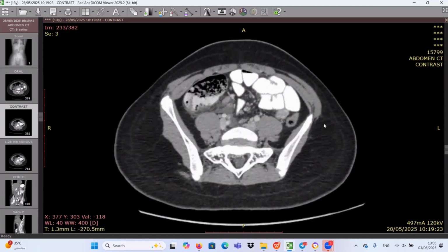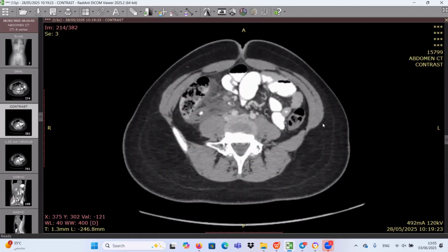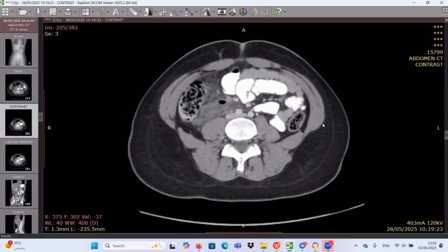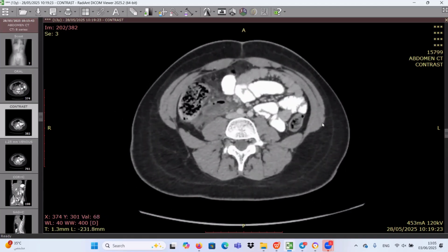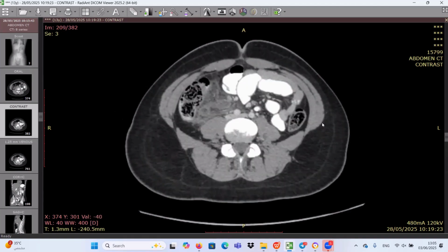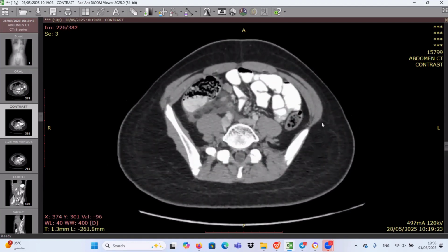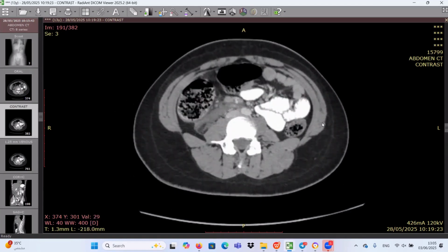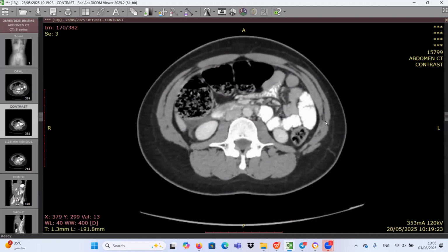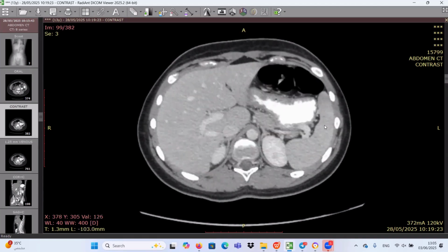So this is most likely acute appendicitis, surrounded by marked fat stranding. I'm trying to identify any complication like perforation. There's a phlegmon around it, but there is no organized collection. Multiple lymph nodes in its vicinity. I'm trying to see if there is any air outside its lumen. There appears to be none. No pneumoperitoneum. I'm checking if there is any venous thrombosis or abscesses within the liver.